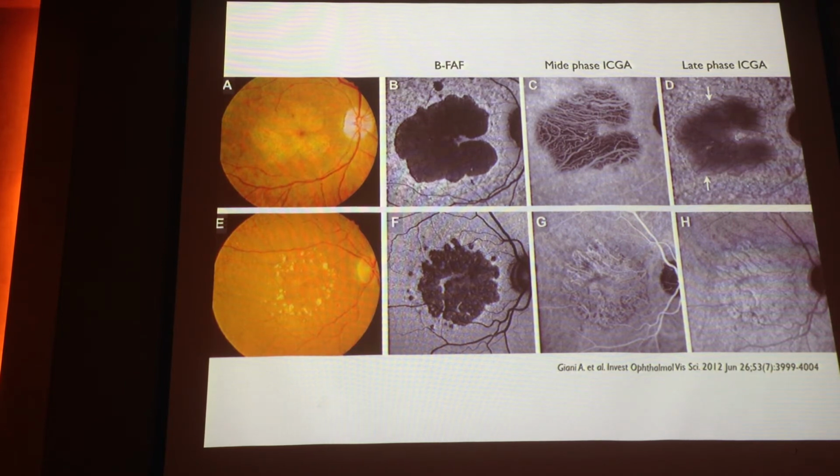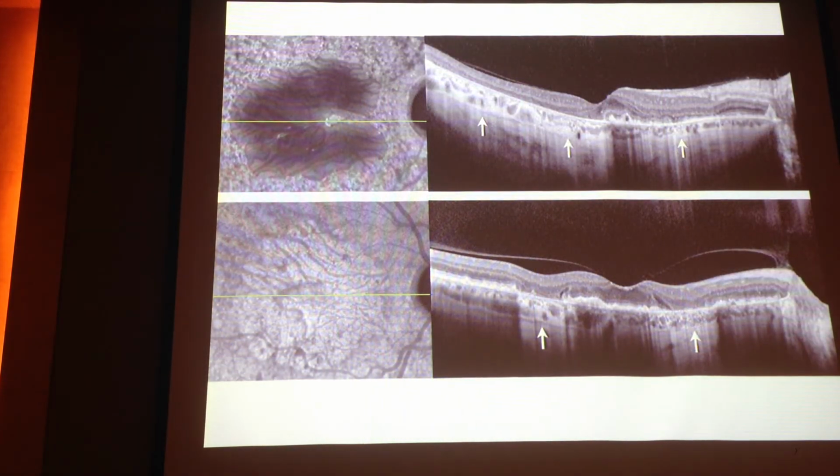So it was quite strange to think that Stargardt has lack of choriocapillaris, since it is not a choroidal disease, why is the choriocapillaris affected, and in macular atrophy secondary to AMD, where we think it's more related to the choriocapillaris, it's still present. So if we look at the OCTs of these two patients, the thickness is the same, so it cannot be related to the thickness.